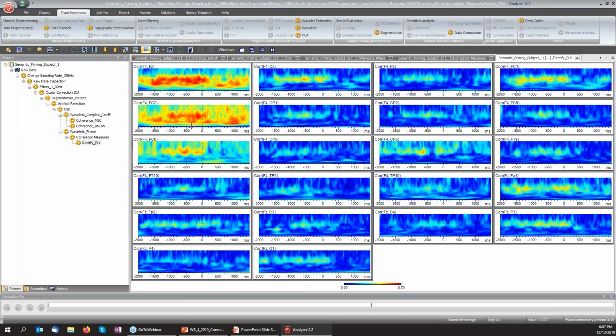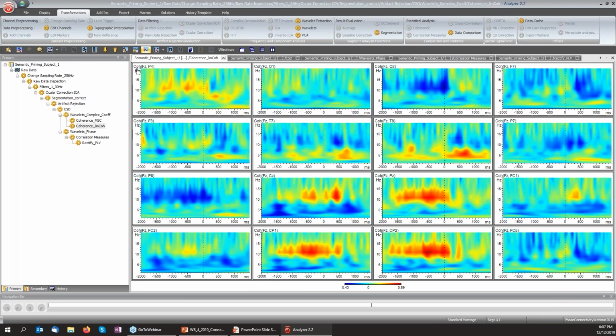For comparison, let me go back to the imaginary part of coherency, and choose just a second.